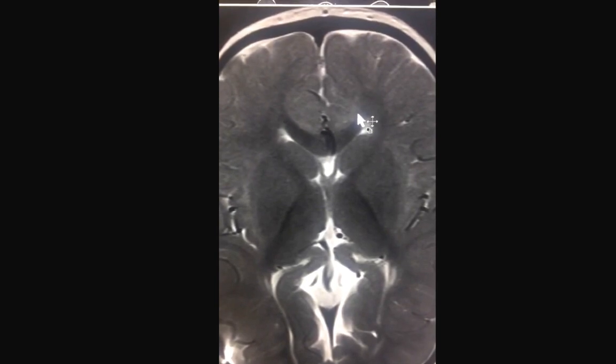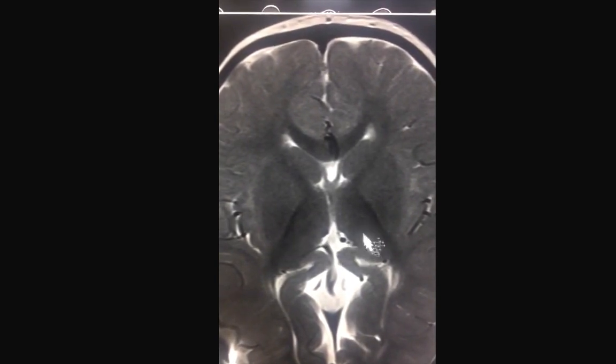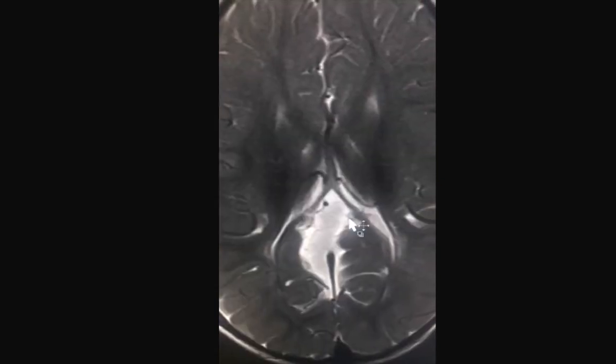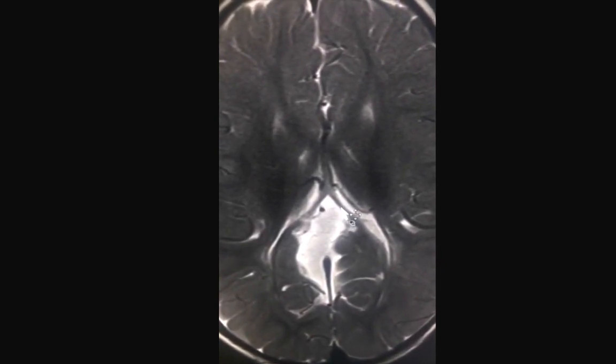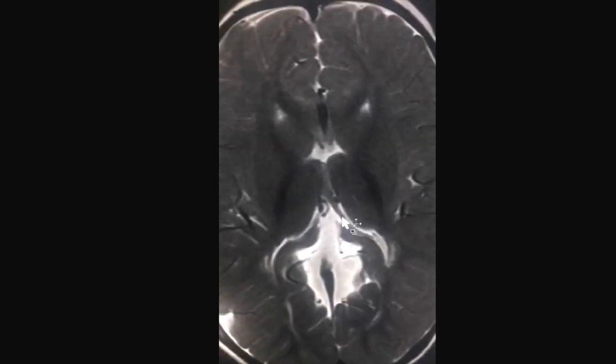Now that you better understand the corpus callosum, notice that the anterior part is connecting the brain here, where there is no connection posteriorly, consistent with the sagittal image. And that's why the CSF spaces posteriorly look funny, and many people would look at this and confuse this for a cystic abnormality, which is not the case.